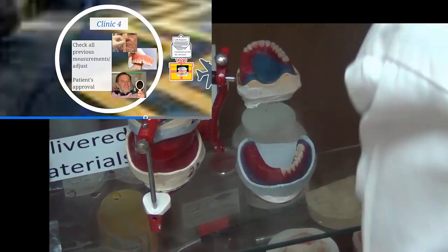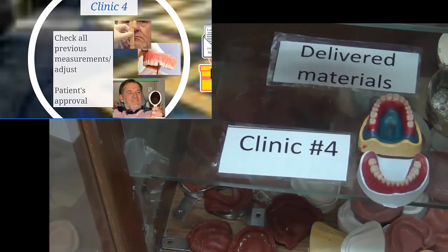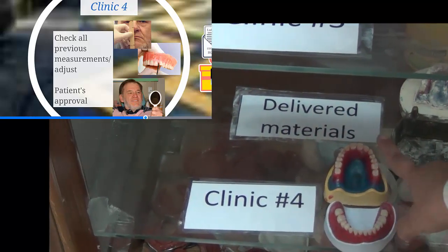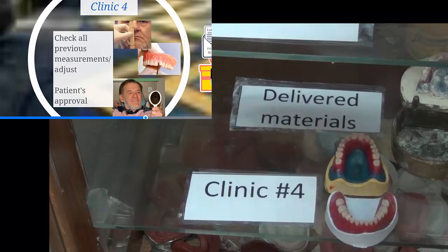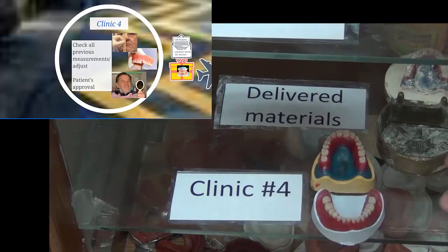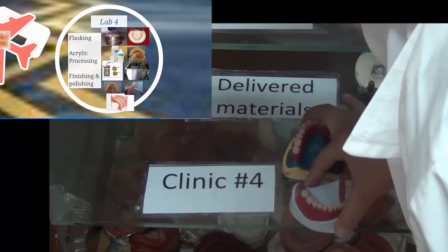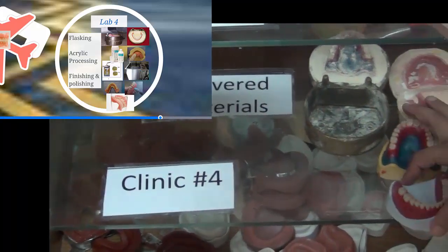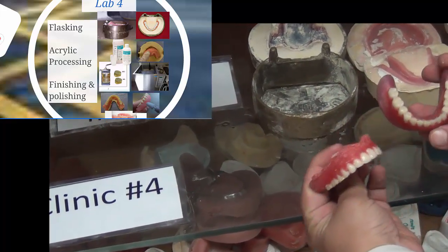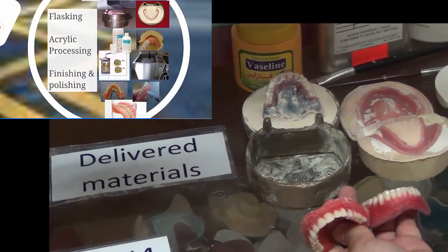So the trial denture goes to clinic number 4 for the dentist to try inside the patient's mouth. The dentist tries them. If they are well and they occlude well, and the occlusion, the phonetics, the aesthetics, and everything regarding that patient are approved, and the patient likes them, this is sent back to the lab. In lab number 4, we need to turn these trial dentures into actual dentures made out of acrylic.